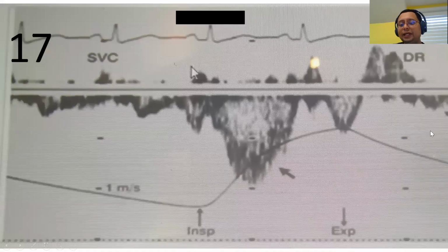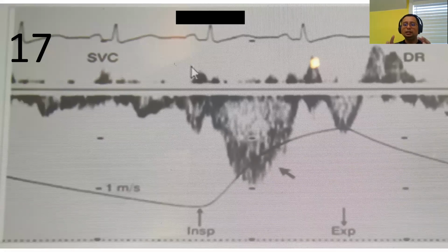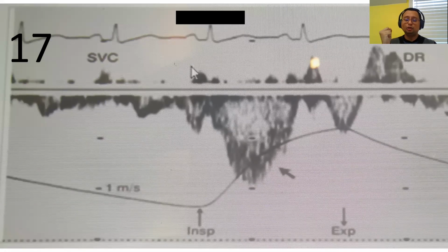Right. Now, this is a patient that has exaggerated interventricular dependence. This patient presents to you. When you look at the echocardiogram, you can see the septum going to the left in inspiration, to the right in expiration, to the left in inspiration, to the right in expiration. But when you look at the tissue Doppler, it is normal. When you look at the hepatic vein, it is normal. So what is happening here? There is just this exaggerated interventricular dependence, a respiratory variation, without other signs of constrictive pericarditis or tamponade. So what are we dealing with?